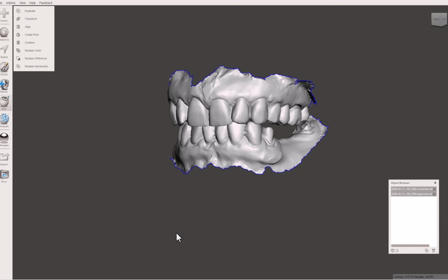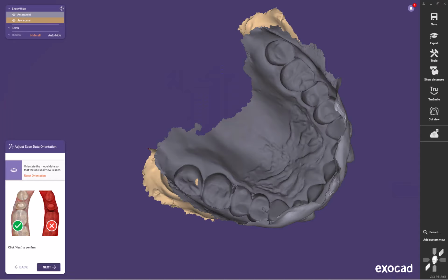This entire treatment planning process took about an hour and 10 minutes, which is fairly typical for treatment planning a complex case, but it allows you to do complex dentistry in an organized fashion and is well worth the time invested. I'm going to run this video in real time so you can see exactly how the process works. So we'll get into ExoCAD and show you how this goes.